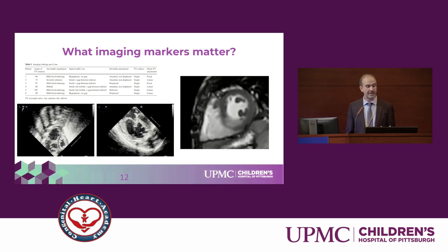the paper included the first 6 patients, and we characterized them nicely by imaging. Reviewing the neonatal echocardiogram is very important in these patients to get all these anatomical details. And sometimes, like in our patient here, you can see that we use the TEE as well. So this is the tricuspid valve leaflet and the attachments to the RV free wall here.